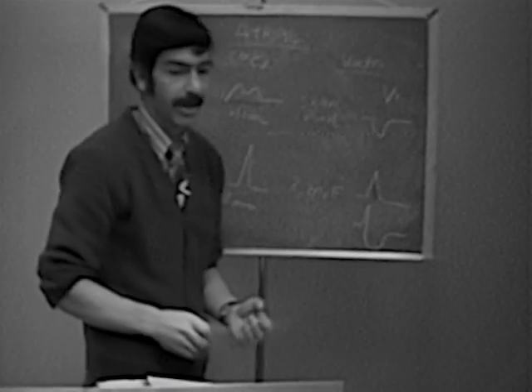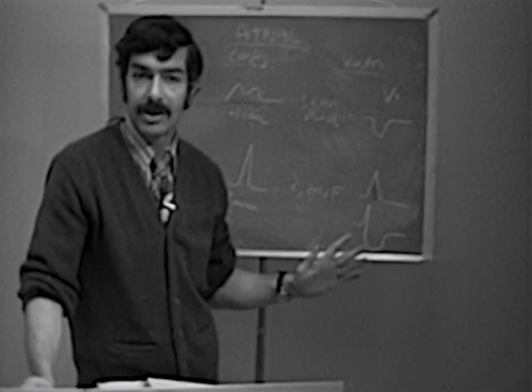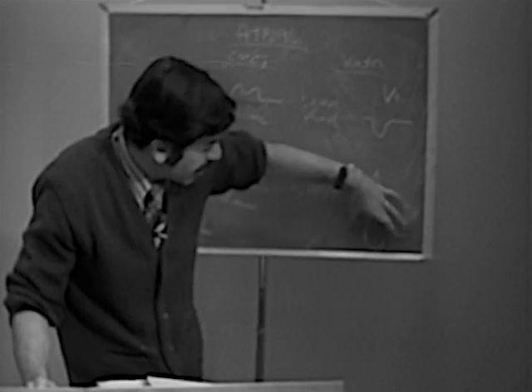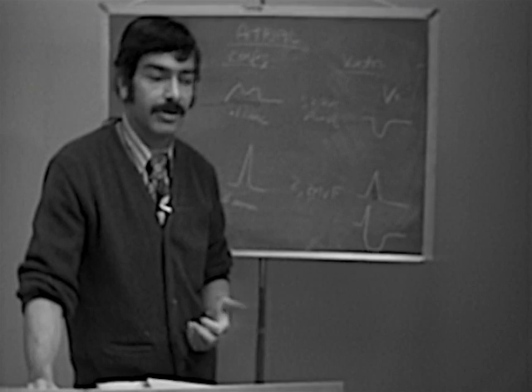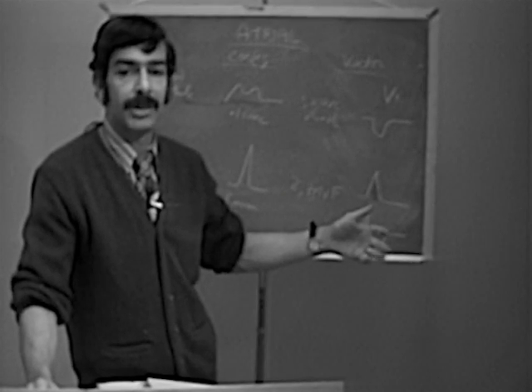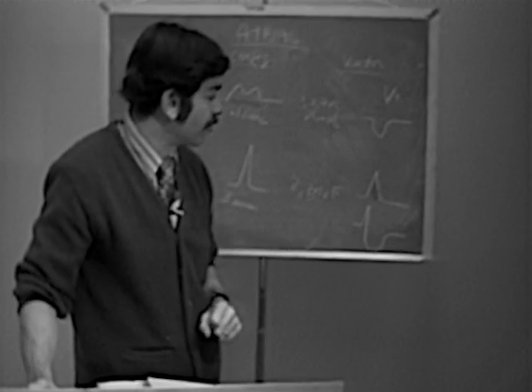But the important thing is not that it's just biphasic. It has to be biphasic and tall and broad, right? And practically everybody that you take an electrocardiogram on, or many persons, it's going to be biphasic. That doesn't mean they have biatrial enlargement. It has to be both tall and of long duration.